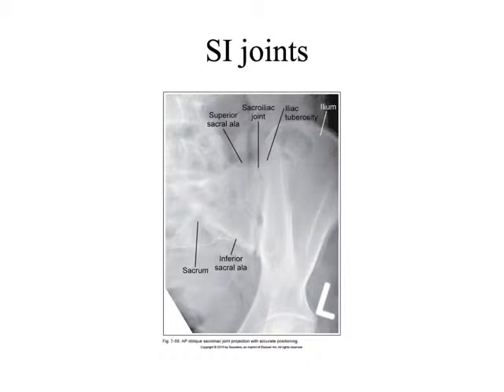One thing that might be helpful, this is not from imaging, but from film studies: we can break up this image into 4 quadrants, right? Like this. What we're giving priority to is this space right here, this centering point. The reason this is important is now I know if this anatomy is centered there, that's probably the anatomy I'm supposed to be paying attention to, because the technologist went out of their way to center that anatomy.